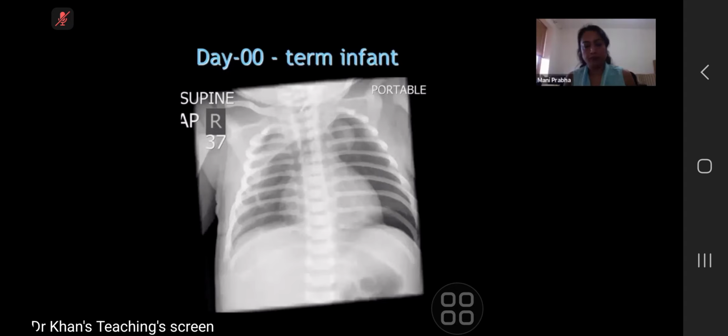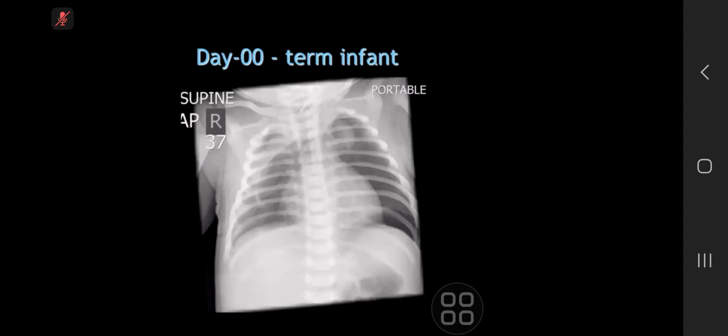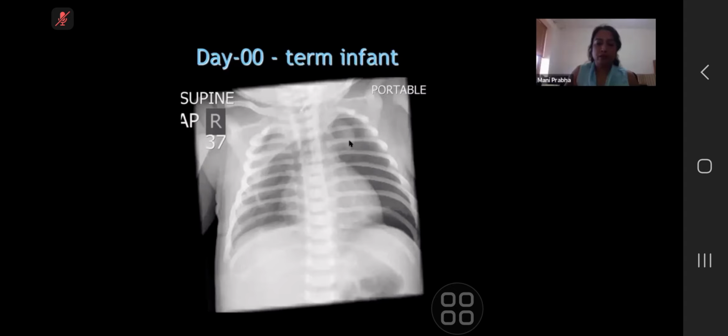So we've got no mediastinal shift, and we've got a hyperlucent left lung. You can also see an opacity projected adjacent to the superior mediastinum on the left, but I think that's probably projectional. You mean this opacity? Yeah.